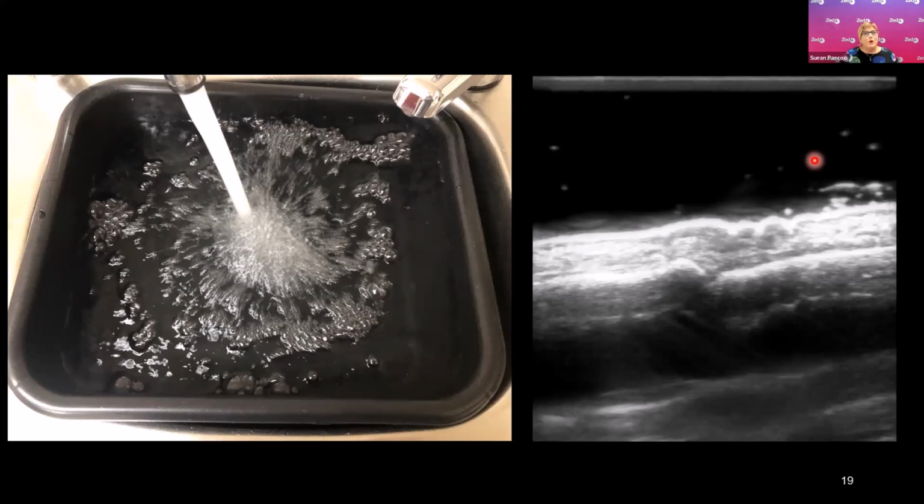So to get around this, you either need to fill the bowl up very slowly and just have a very low trickle of water, or you fill the bucket up quickly and then set it aside for 10 minutes or so. Now, the air bubbles that you see in this video were there after the water had been sitting for about 5 minutes. So you probably need to leave it a little longer than that to make sure those air bubbles disperse.